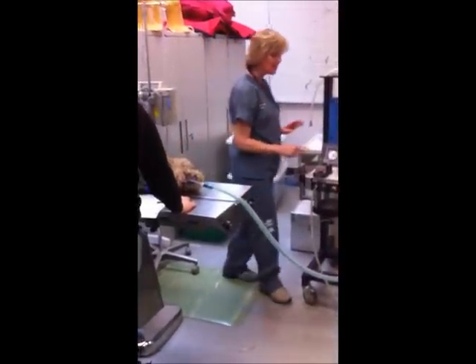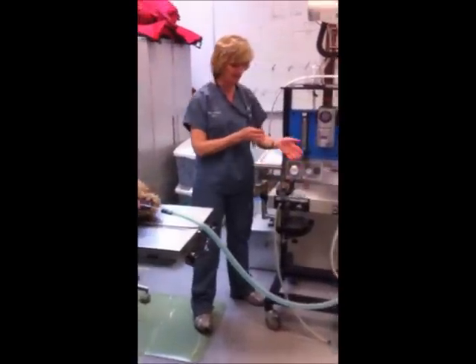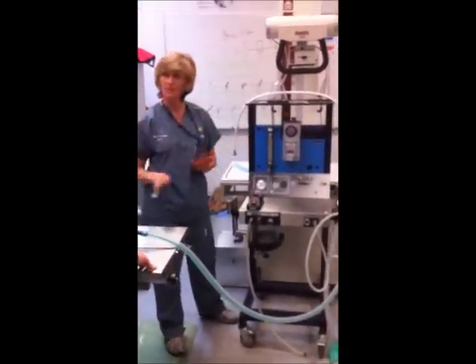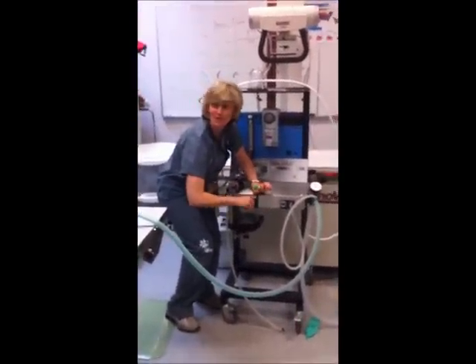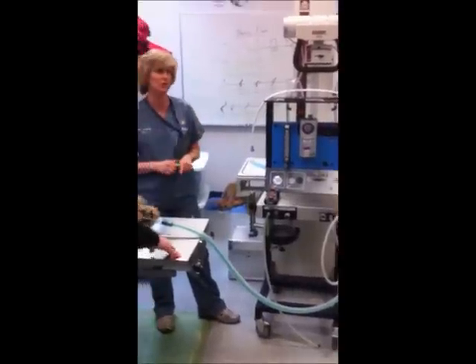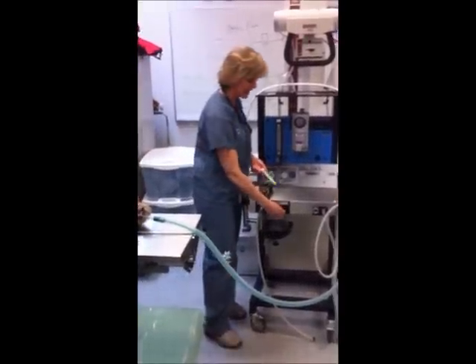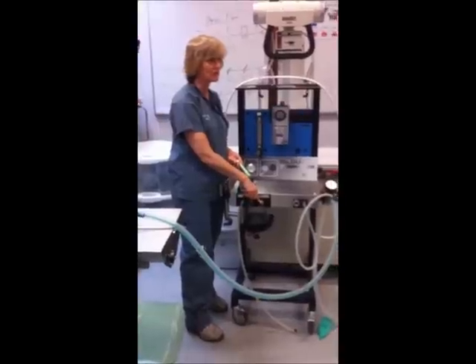You need to know what the pop-off valve is, and how it relates to the scavenge system for the written test. But for the practical test, I'm not going to close it when you're coming in and then take your mark off because you didn't open it. I won't do that to you. But I'm happy when I see students checking that, because that's a bad mistake to make, to leave that closed.